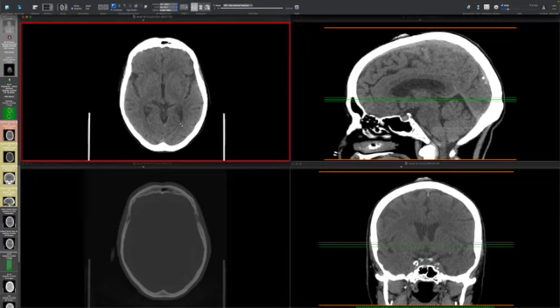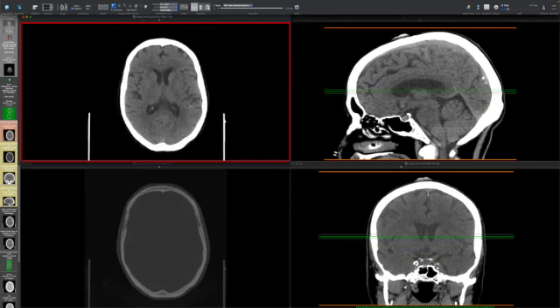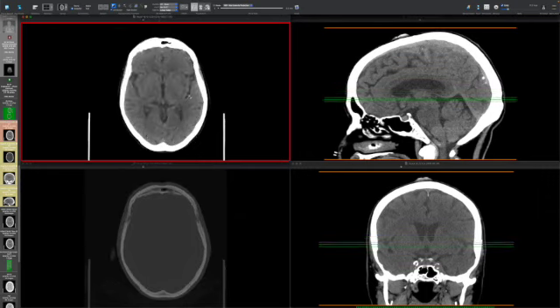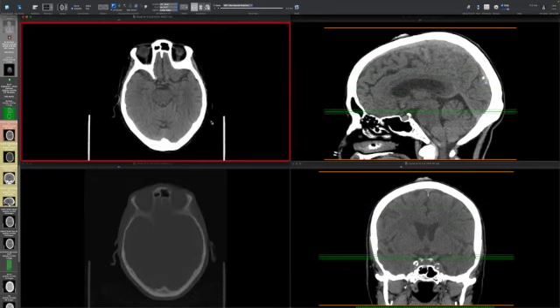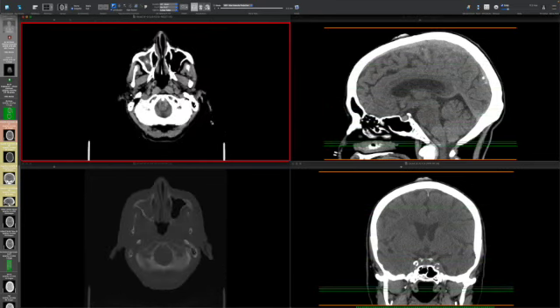Small amounts of hemorrhage can hide there, and if you don't look, you won't see them. And in the dependent portion of the sylvian fissures, which is going to be back here on both of these sides. So those are three places that I always look for subtle subarachnoid hemorrhage, basically at the end of every study, particularly in a patient that has headaches that are unexplained.